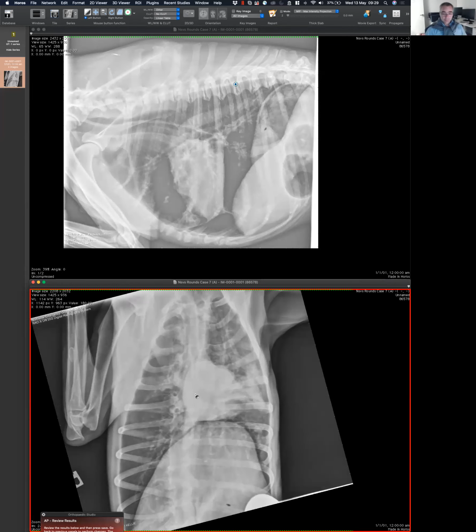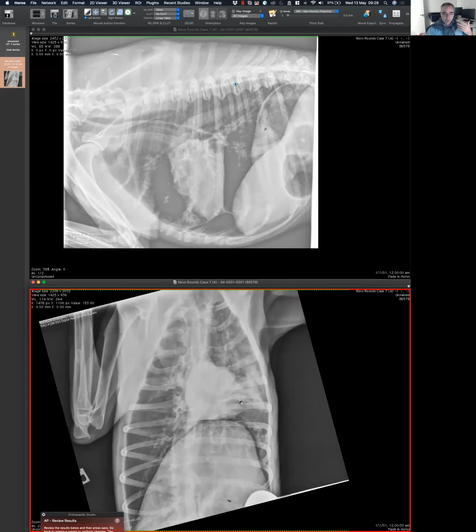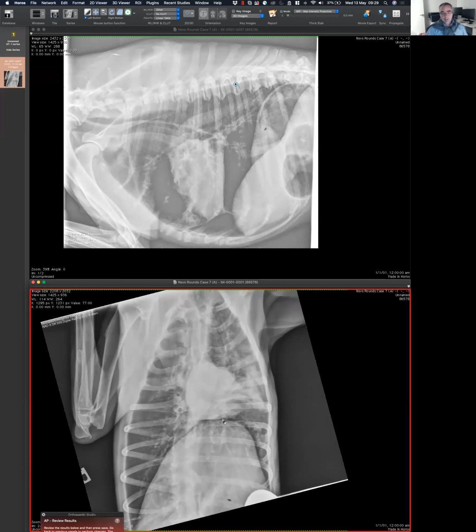And here I think I like it. It's very interesting. So here, what do you think about this? Because the heart seems to be more on the left hemithorax. There seems to be no heart on the right hemithorax. So no one mentioned that, but that seems to be the case. And now we come to the second technical issue, which is this radiograph is oblique. So see, the spine is not in the center, and the spinous processes are not like small dots. They should be just around the very, very dense thing. So this radiograph is rotated.